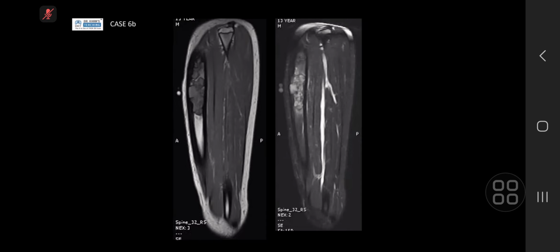So osteoblastoma would be my differential now. Sorry, what was that? Osteoblastoma, but it's not a typical location for it. Is it a diaphyseal and cortical osteoblastoma? Okay. Yeah. So there are a few things that you can get in the tibia, and they're tricky.